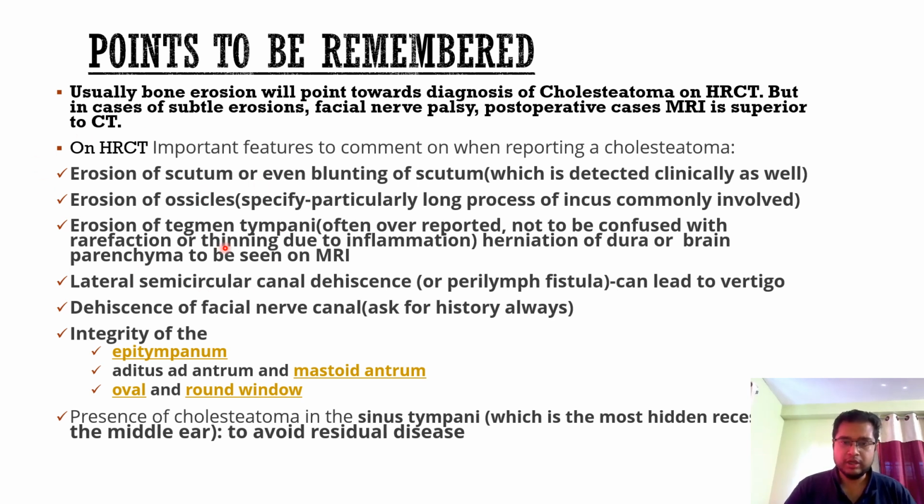Secondly, when there is erosion, the clinician will ask you to report on herniation of the dura or the brain parenchyma within the ear cavity. That is actually not seen on HRCT. HRCT itself is constructed in that particular window, where we do not see the brain parenchyma. So it cannot be reported in that way. We have to get an MRI done to definitely look for proper herniation of the dura or the brain parenchyma. So again, there is a limitation of HRCT in this particular case.